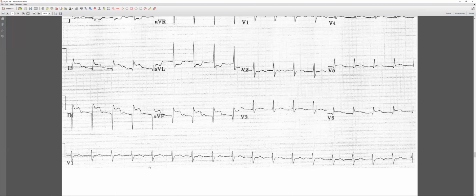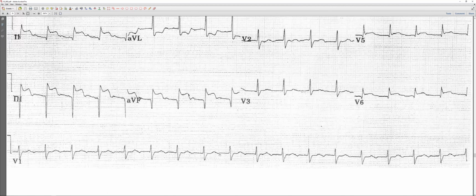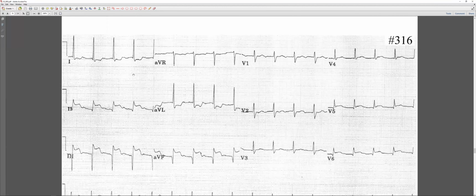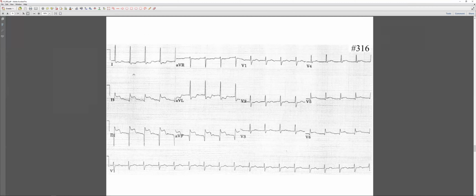Well, okay, let's see. I think these are the P waves right here and here. Can you see the P waves? Oh, the mouse is in the middle of two leads. Yeah, you're pointing very far from the QRS complex. Okay, so there's a long PR interval. Yes, a long PR interval, and there is a long PR interval in each one. So it's a first degree AV block. Correct.